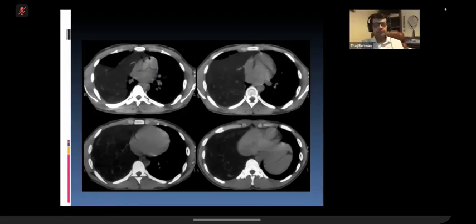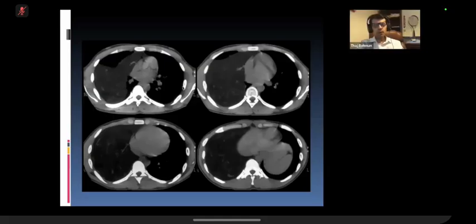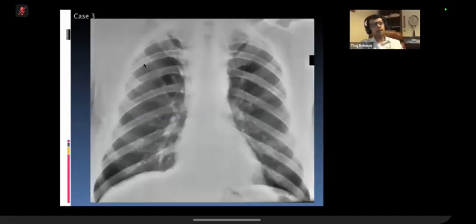So the thymus? Yeah. So this is a lesion arising from the thymus, and is so big it has got a peduncle and it is spreading into the chest. So it's a very rare tumor. So it's a thymolipoma. Yeah, myelolipoma, very similar. So thymolipoma or myelolipoma, I can't remember. So it's a fatty tumor from the thymus. Good. So next one.